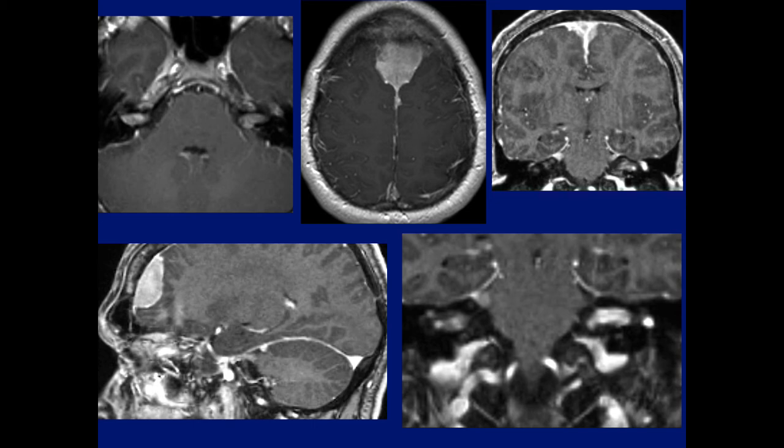Okay, what is this condition? Very good. Gino and Asif came up with the right answer here. Multiple lesions involving meningioma, IACs, and trigeminal nerve on the sagittal plane that I'll show. Here it is again on the coronal. This was a 21-year-old male with NF2. This is just to show the trigeminal.